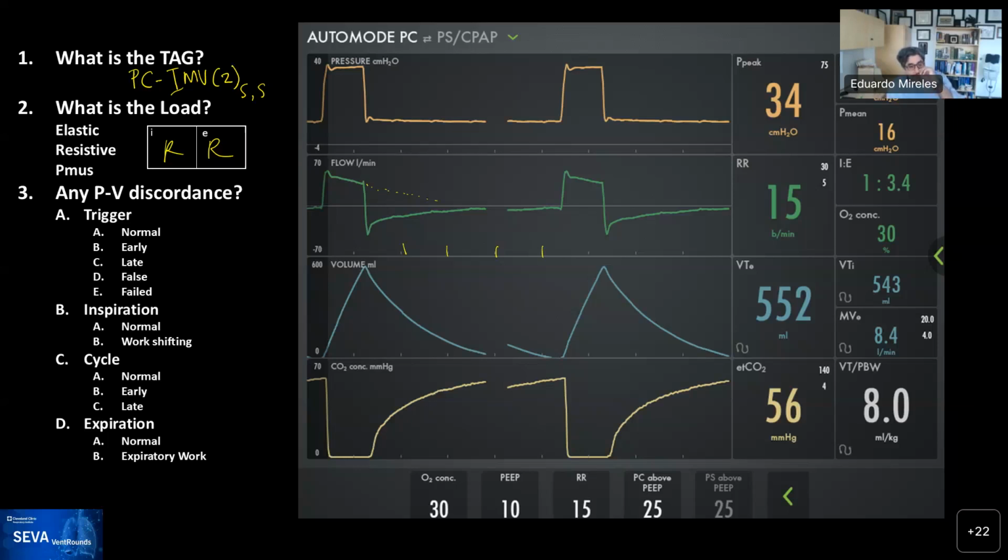This patient was passive at that time, and it was not from paralysis. It actually was from sedation. So we stopped the sedation, and he's on this mode because we are anticipating the patient waking up and interacting more with the ventilator. So you will see that although this patient had a rate of 15, the aim is that as the patient starts waking up, it starts activating pressure support, and we don't use this baseline respiratory rate anymore, and the patient can regulate itself.